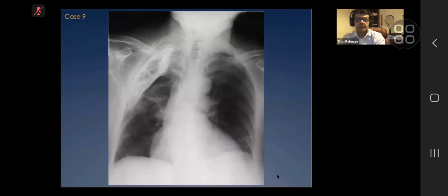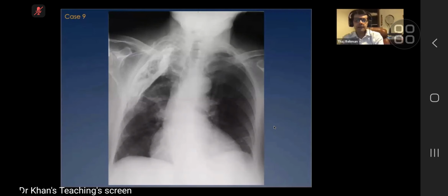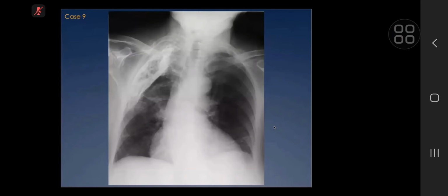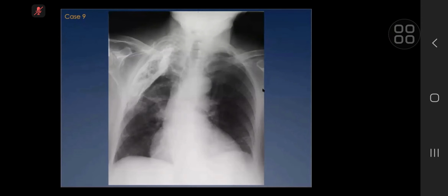It's a calcification in the pleura, apical pleura. So calcified pleural plaque. Is this how pleural plaques appear? Yeah, it's not the typical appearance, but I agree. That's because it's not a pleural plaque. Pleural plaques have a typical appearance of leafy, edgy calcium with central lucency. This is a heavy, dense calcification in the pleural space, and you can call this a calcified fibrothorax. That's the term you can use for this.